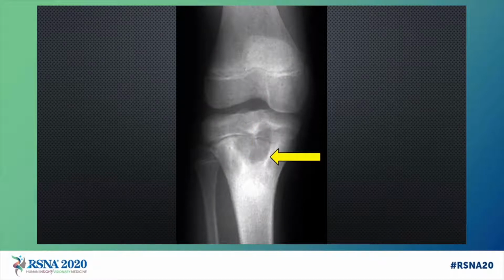There is also a well-defined margin with sclerosis that fades out. This is typical of irritative margins, usually caused by an inflammatory process or infection. This is a Brodie's abscess, and the shape is caused by the infection burrowing through bone.